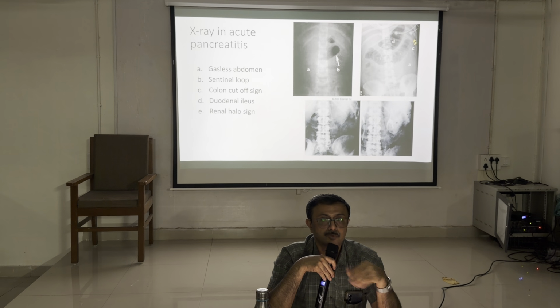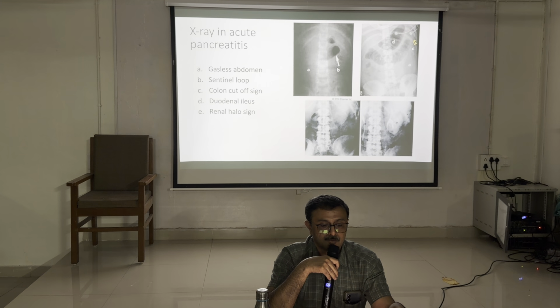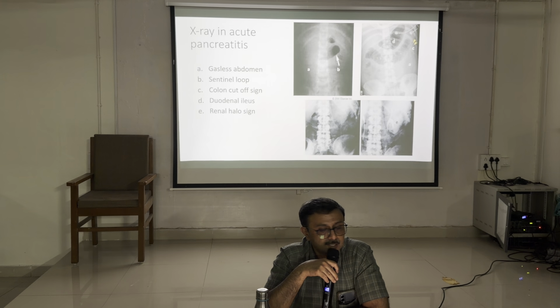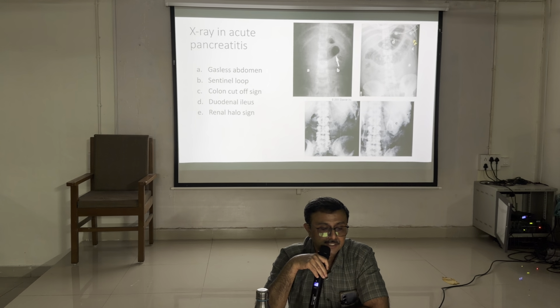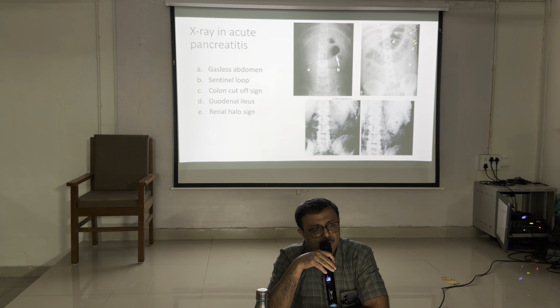All signs are not possible in the same patient, and every patient may not have the same signs. So first is gasless abdomen. Then the sentinel loop, one of the gas-filled loops of bowel.